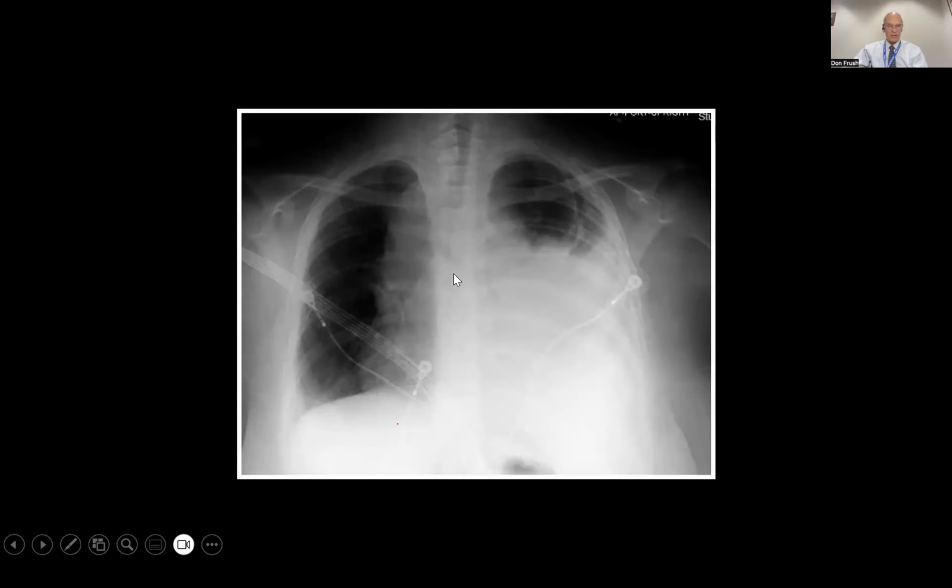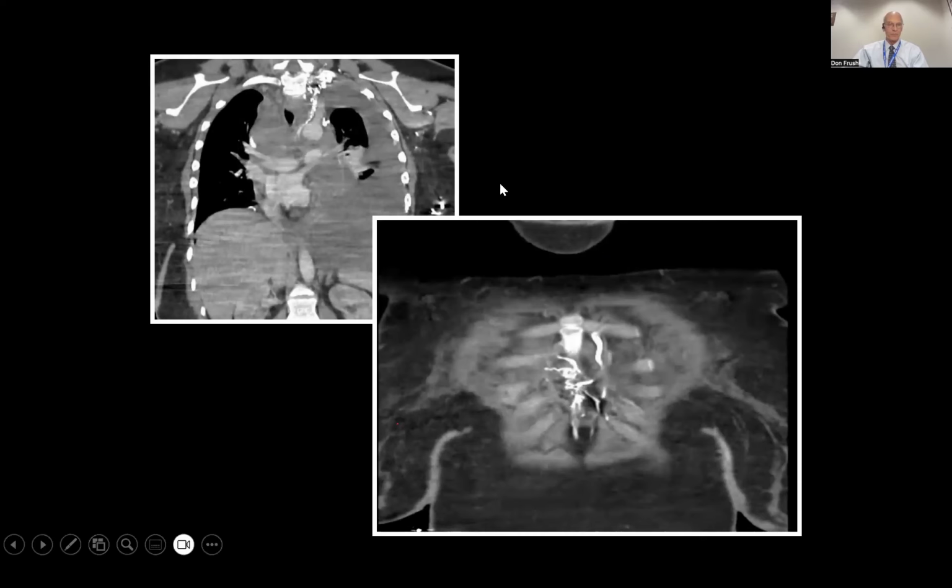Now we look at this one. Okay, is this collapsed lung or we've got nearly a white lung? And, you know, it's not as helpful here, but certainly the heart and mediastinum aren't shifted towards the side of white. If anything, you're seeing more mediastinum over here. You're seeing a little more heart, and the trachea isn't shifted, a little bit of a meniscus. So this is probably a combination of fluid and consolidation along here.